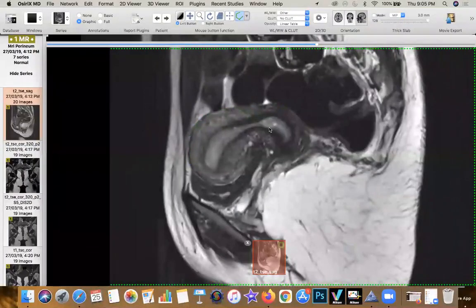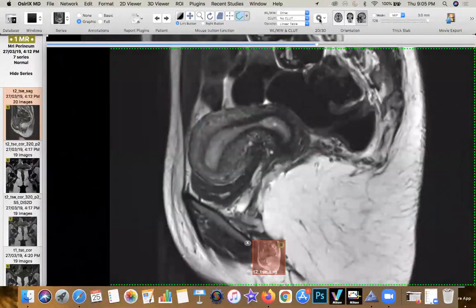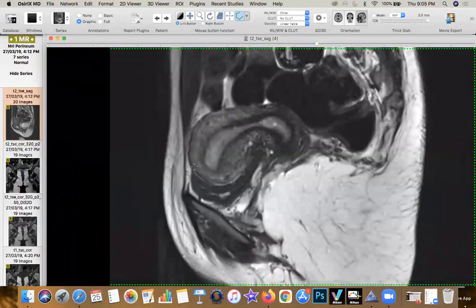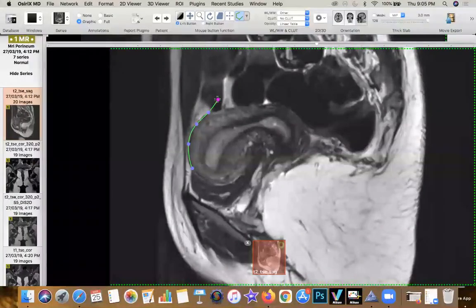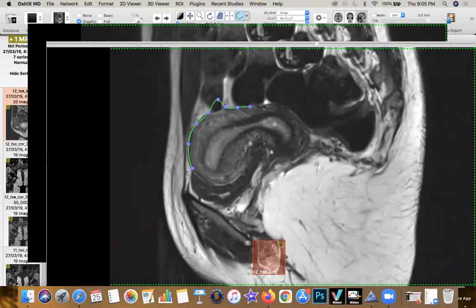In the same way, you tend to get an outward convex, or a more posteriorly oriented convex curvature. That is very important to remember because any change in this contouring, any tenting, any focal protrusion is going to cause a lot of issues when you're trying to see what anatomical structure is causing that tenting or tethering. Now, what I mean by tenting, have a look at this. Suppose this is the change in the morphology of the corpus, if I see this kind of an approach, that means the posterior wall is getting pulled up by some structure. I need to be very, very careful.